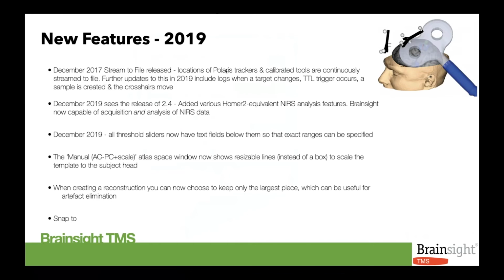And then I don't know when it was introduced, I think it was in there before I started, but at the bottom is snap to, and it means that when we create a grid, we can snap those grid nodes to our curvilinear brain. Previously, we had to use a curvature slider, which snapped those grid nodes around a sphere. Obviously, the curvilinear brain is not a spherical object.